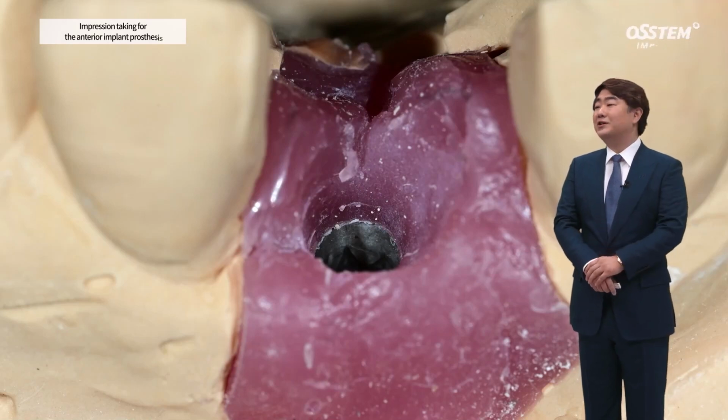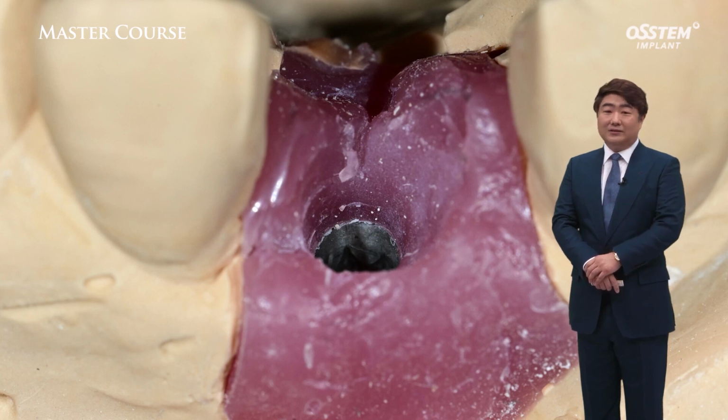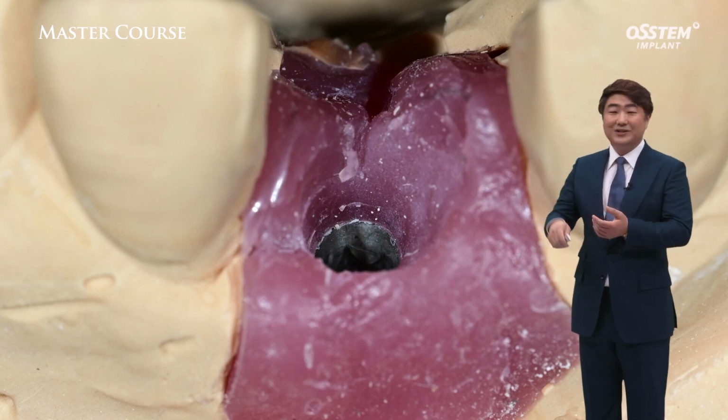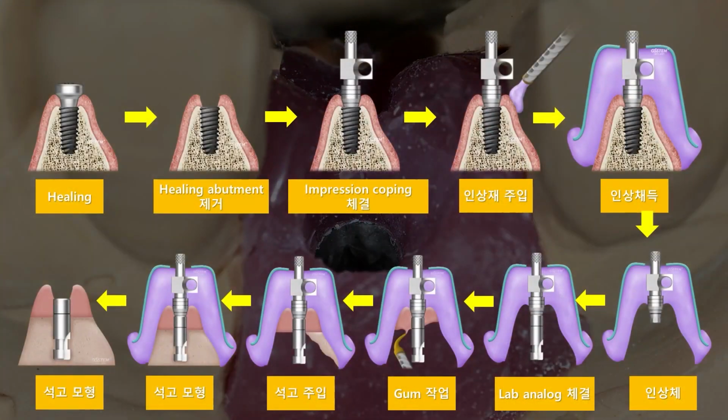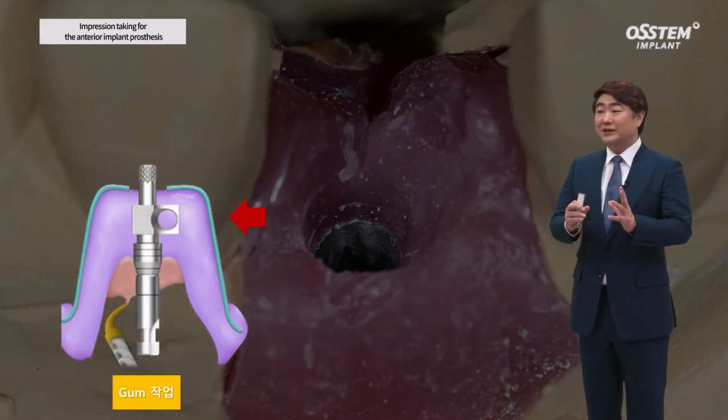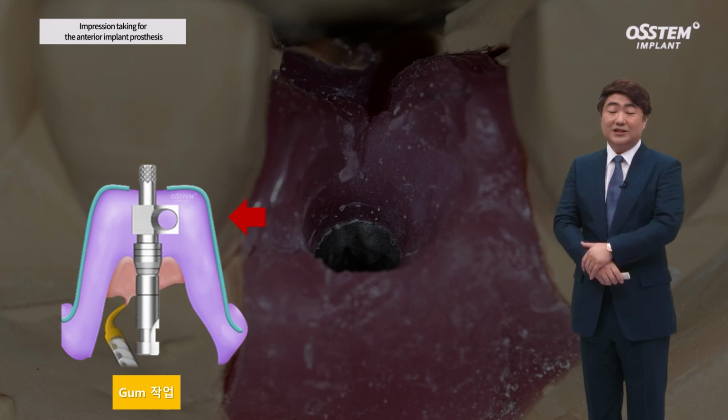Hence, to include the running room, rather than abutment level, an implant level impression is necessary. And in this model, if you see the running room area, there is a horizontal line, and that is the impression coping line. And if you use impression coping, the running room created by pouring that in the model is the external shape. Of course, that can change depending on the size of the coping.